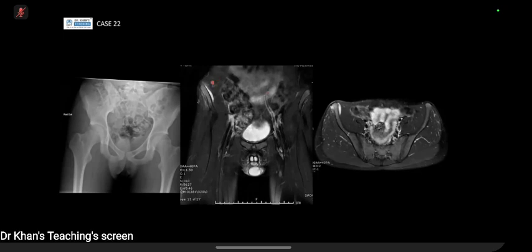And I think on first impression, if you just saw this in isolation without the X-ray, you can think, is this something a bit more worrying because of the marrow edema, because of the soft tissue swelling? Can it be something a bit more sinister like sarcoma? But then seeing the X-ray is very reassuring, and of course seeing the axial showing that cortical disruption, so that's your cortex and it's kind of fallen off, and with hematoma and callus formation and healing.